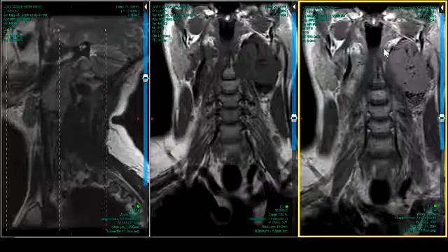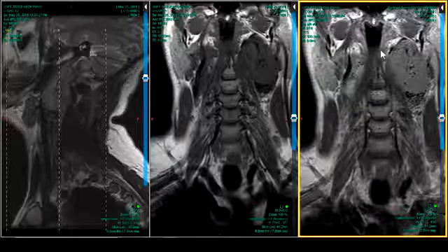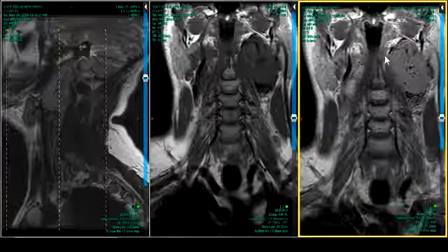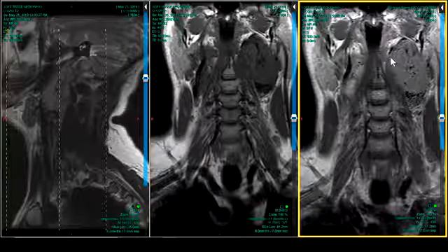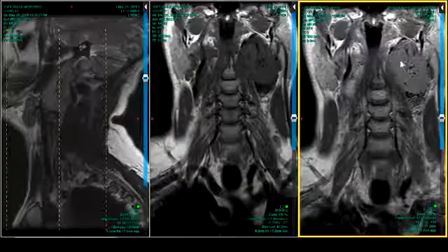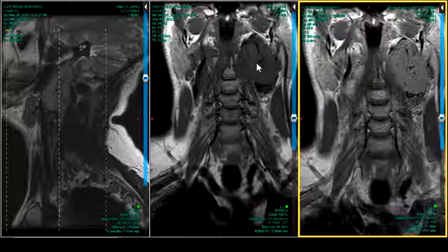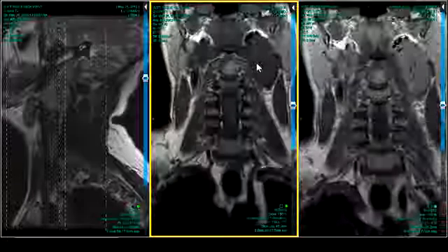Leaves behind a path of metal, small little metallic flakes that are beyond the resolution of even an X-ray, from their instruments, and those show up very frequently in MSK and in head and neck surgery too, as small foci of hypointensity that become more bizarre in their shape and signal on gradient echo imaging. That's called blooming. So that's kind of the spectrum of low signal abnormalities within a mass.